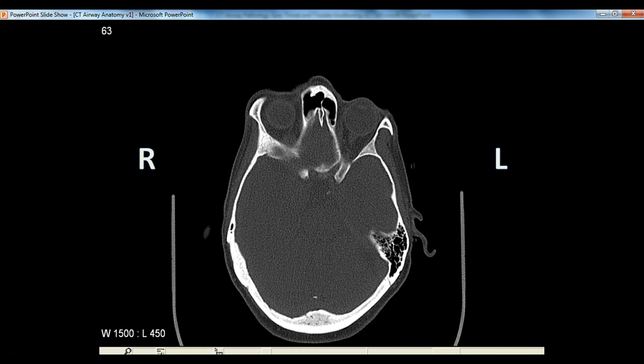So in this case, what we're seeing is on the patient's left, and from here on out I'll just say left and right to refer to the patient's left and right. You can see an ear, you can see that area that looks like cobwebs, that's the mastoid airspace. The big gray central area surrounded by white is the brain. That surrounding white, high intensity white, is bone.